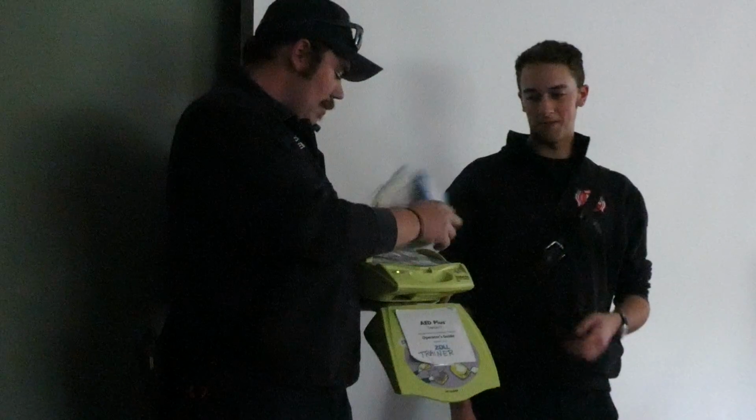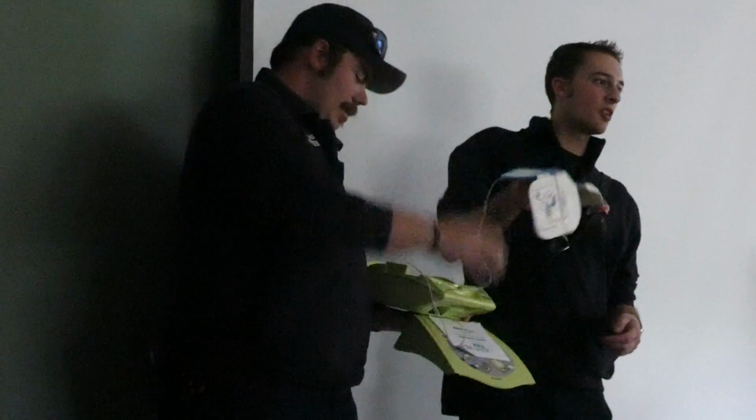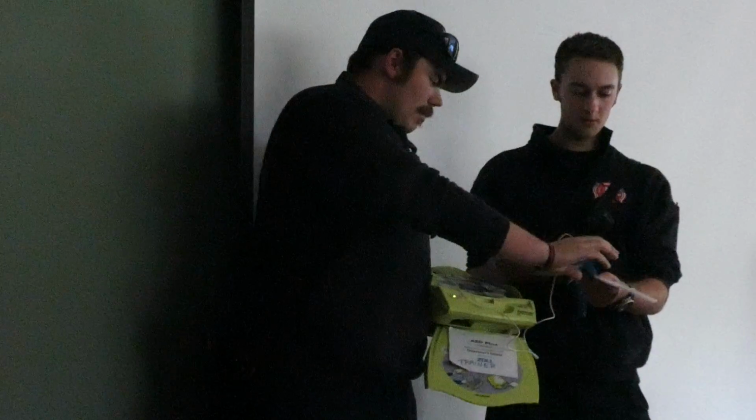Stay calm. It'll talk to you and give you instructions. Check responsiveness. Call for help. Oh, that's cool. Attach defib pads to patient's bare chest. So yeah, it'll just walk you through all the steps. You don't even really have to think too much because it explains everything.